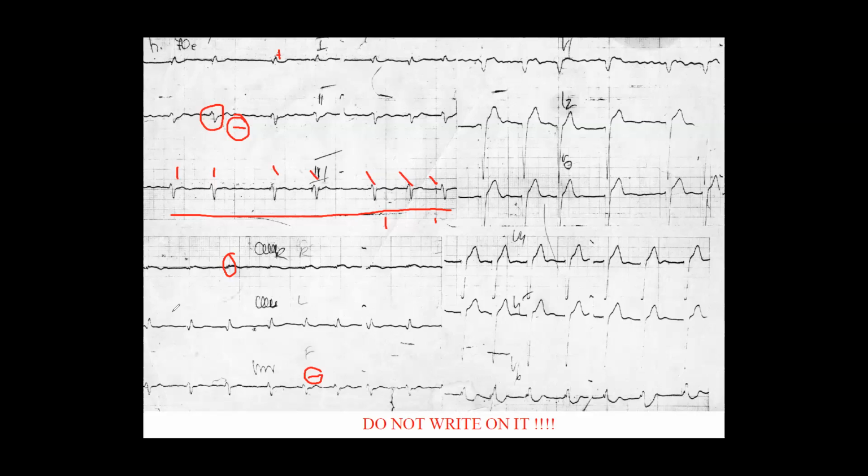I don't think there's a P wave. Very good, there is no P wave. Or if you do see in lead number 3 a lot of waves, or in V1, if you do not see nicely, you should go for V1. And immediately you see that there is no P wave, because the P wave should be a discrete round shape.